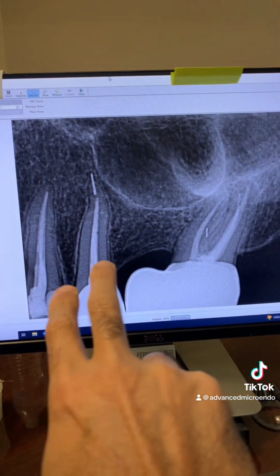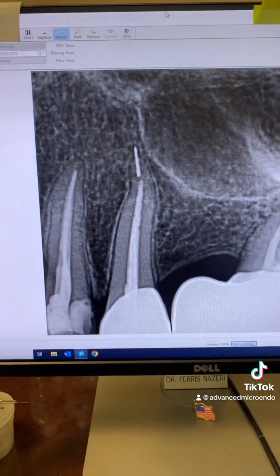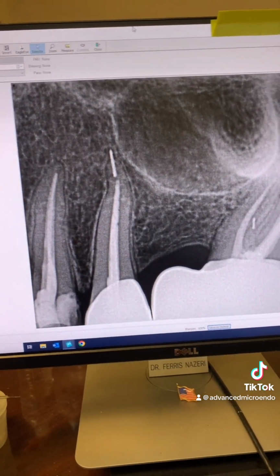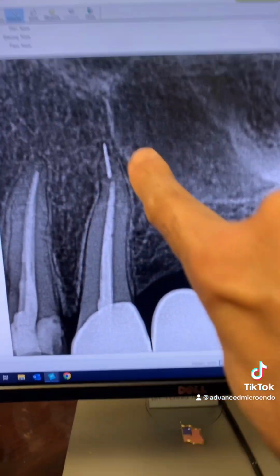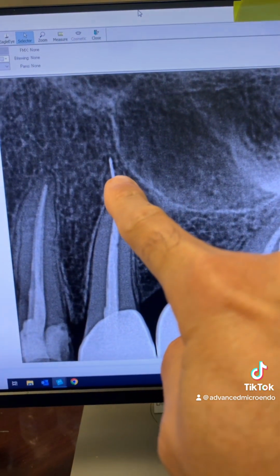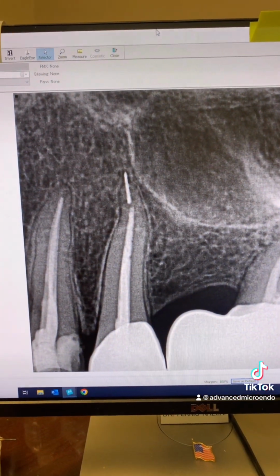these root canals. Well, let's talk about these two. These two root canals were done, according to the patient, 2 or 3 years ago here in SAC. Okay, so the patient has no symptoms. And take a look here. We have a broken file. And that broken file is actually out of the root.